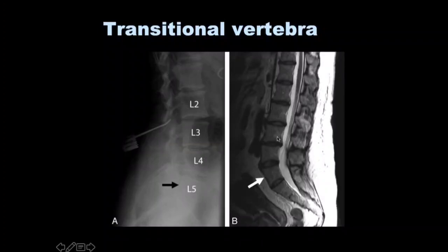When you put that in the report, if the patient needs spinal intervention of any description, they would be doing it under fluoroscopic guidance, and this is what the spinal surgeon or the MSK or the neuroradiologist would be looking at when they're doing their spinal intervention work. They would be classing one particular vertebra. So if you imagine there's a bit of a discrepancy, somebody might just say this is an S1, which has got a slightly odd appearance, in which case there can be medical legal implications and clinical implications as well.